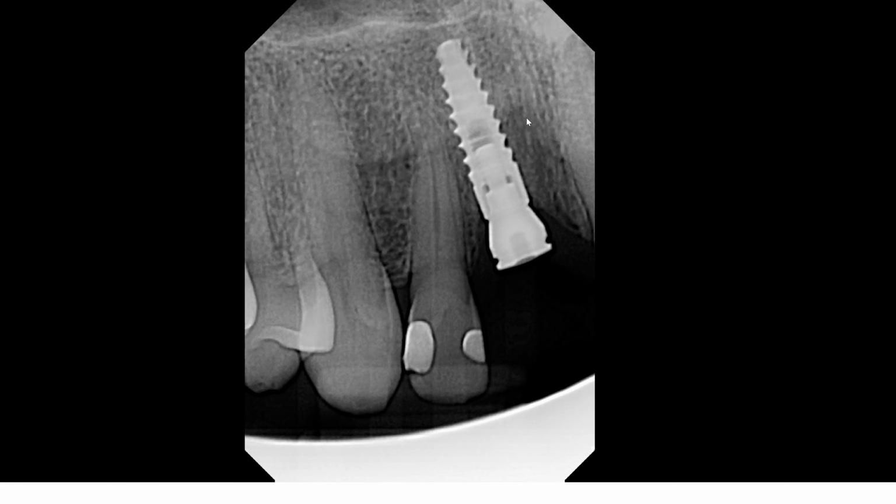So besides that, I want to mention one more thing. Here we have a radiopaque zone at the bottom of this radiograph. This is a classic representation of a cone cut, and I want to briefly discuss how or why a cone cut image is generated. In this example, the clinic was using a round cone. That again tells you that this radiograph was not captured at our school. We use a rectangular collimator. So this was taken from outside, and this patient was referred to the school for some other treatment.